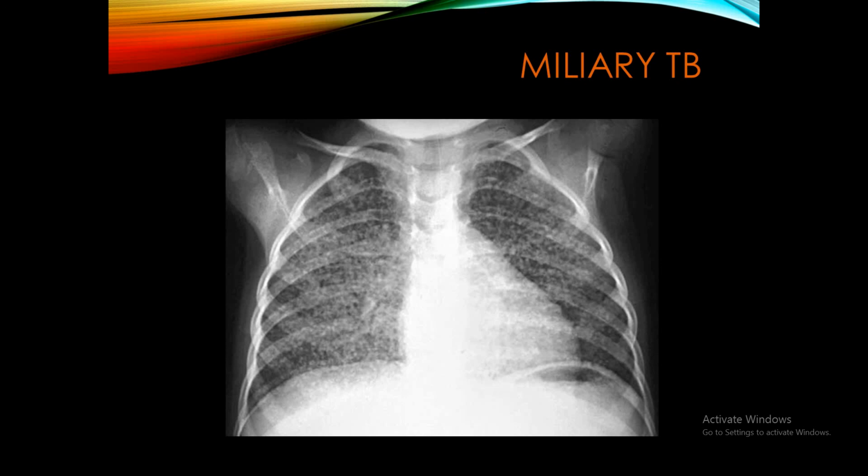This is an example of miliary TB. طبعا miliary shadow عادة يجيب هذه الصورة small أو tiny nodules diffusely distributed in both lungs. والديفرنشيال diagnosis مثل ما ذكرنا ممكن تكون infection مثل التي بي والchickenpox والهيستوبلازموسيس، ممكن تكون pneumoconiosis اللي هي occupational disease، وممكن تكون metastasis.